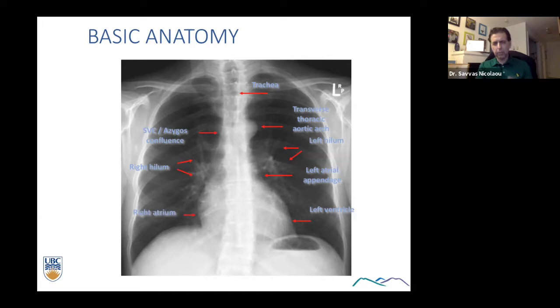Remembering, and we'll show a schematic depiction, the right ventricle sits in a very anterior located position that is obscured with the left ventricle because they have the same radiographic density. We have the right hemidiaphragm on the right, we have the left hemidiaphragm on the left, and then we have the costodiaphragmatic recesses that form very sharp acute angles.